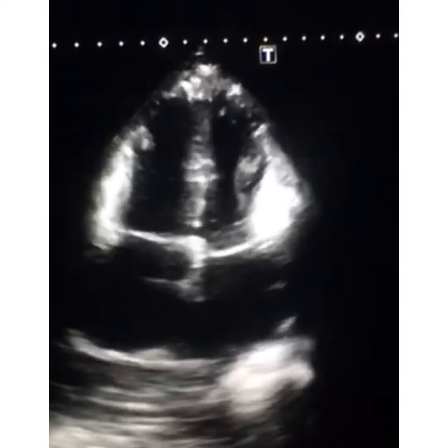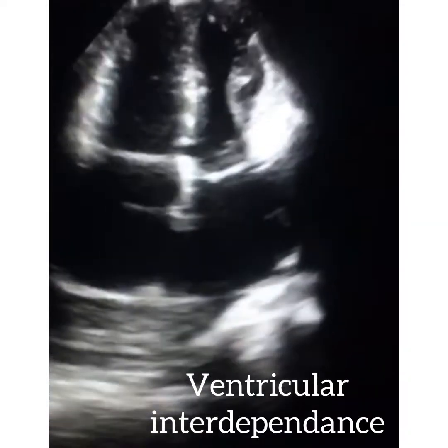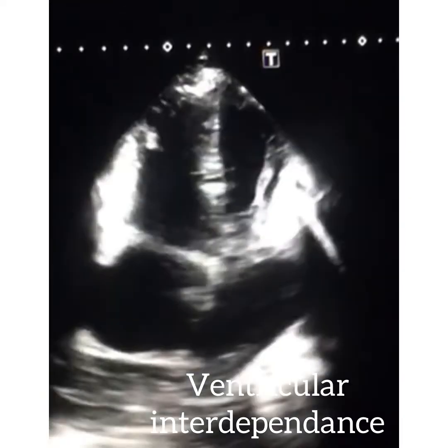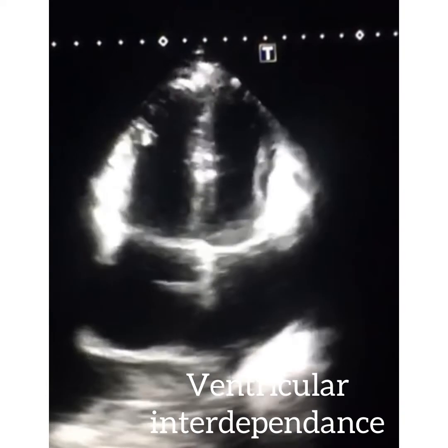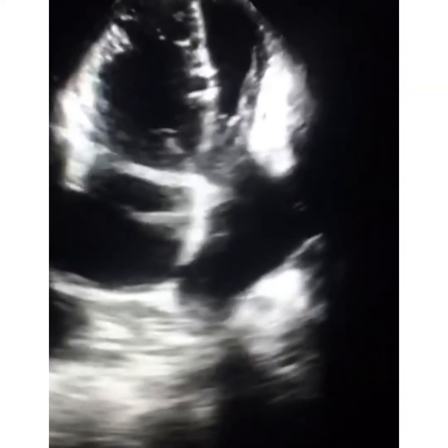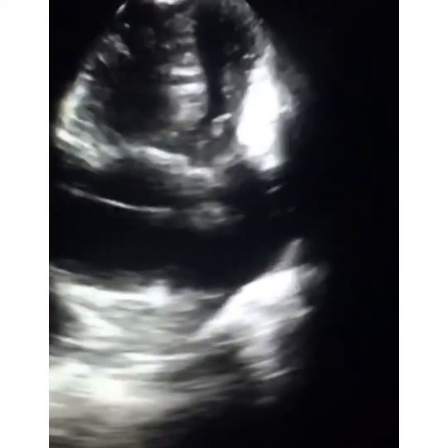Now see the 4-chamber view. In the 4-chamber view, you can clearly see the ventricular interdependence, which is the abnormal movement of the interventricular septum during diastole, which changes with inspiration and expiration. This is called ventricular interdependence. The thick, shining, and calcified pericardium can also be seen very clearly around the heart.